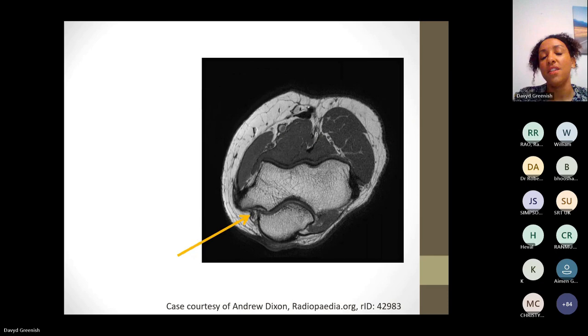Next, just looking at different kinds of structures in MRI, just so that you've seen one or two of the slightly left field structures. Okay, so we've done fat can be bright when you haven't fat suppressed it, and that's like in this image. Bone here, we've got the dark around it, that's the cortex of the bone. We've got muscle, which we know is grey now, but we've also got a tiny structure here, which is labelled.